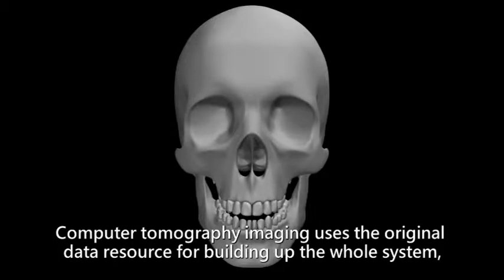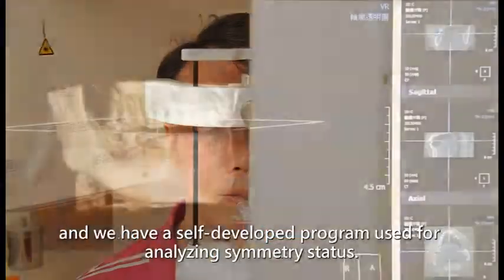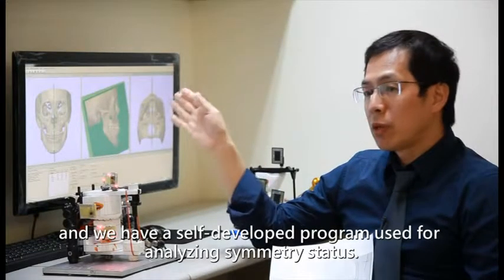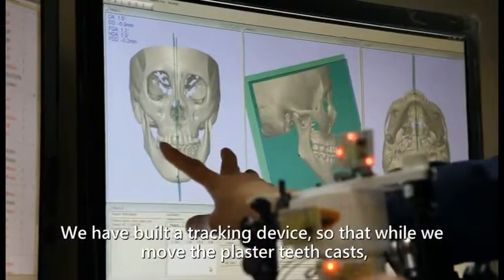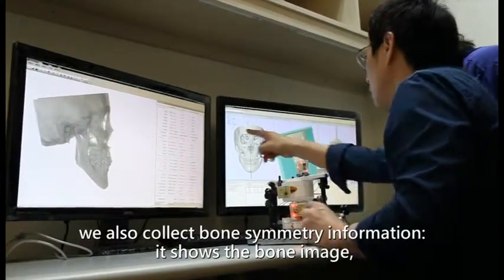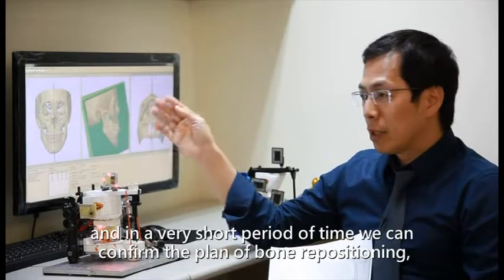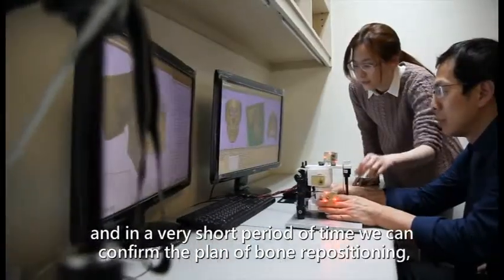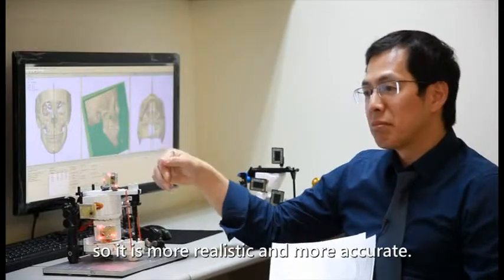Computer tomography imaging uses the original data resource for building up the whole system, and we have a self-developed program used for analyzing symmetry status. We have built a tracking device so that while we move the plaster teeth casts, we also collect bone symmetry information. It shows the bone image, so we can look at the symmetry status, and in a very short period of time, we can confirm the plan of bone repositioning. So it is more realistic and more accurate.